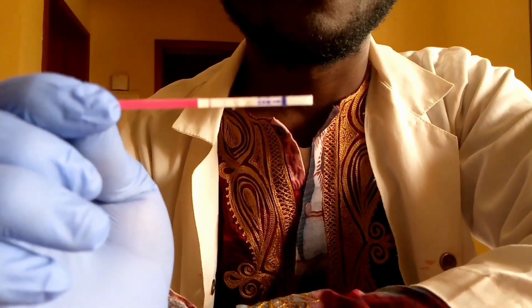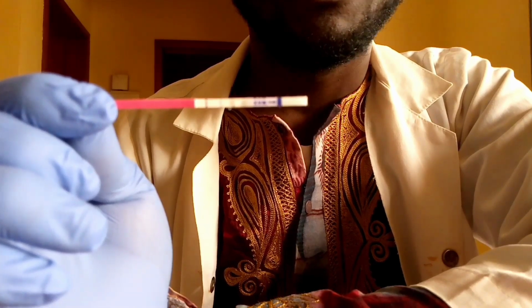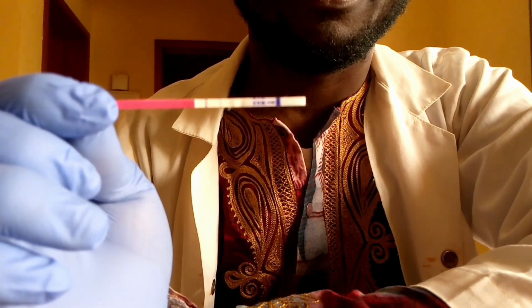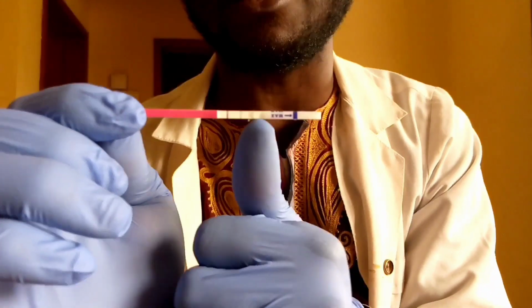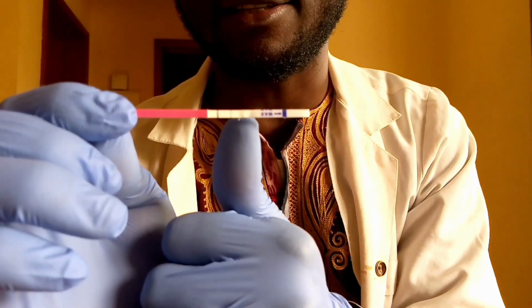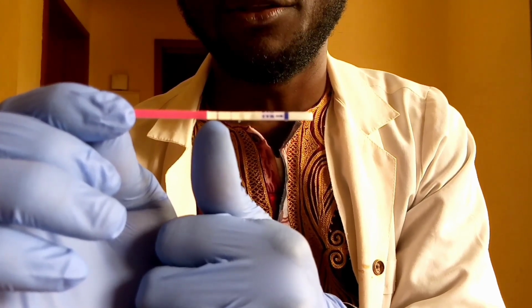So this is ovulation. This is an ovulation result using a urine sample. And if you look at this result, you will be saying that, oh, it is a positive result. No. This result shows two lines. And as you can clearly see, there is a first line from the direction where we apply our sample. This line, we call the test line. And there is a second line away from the direction where we apply our sample. This we call the control line.